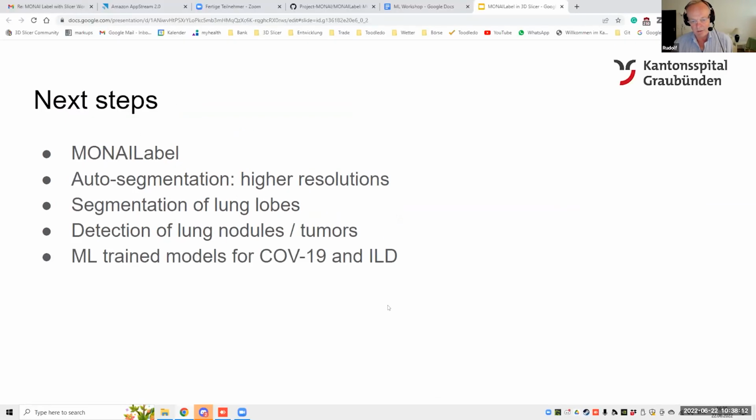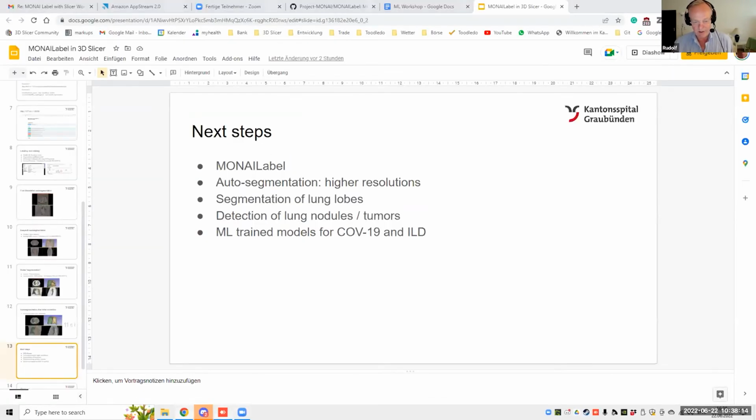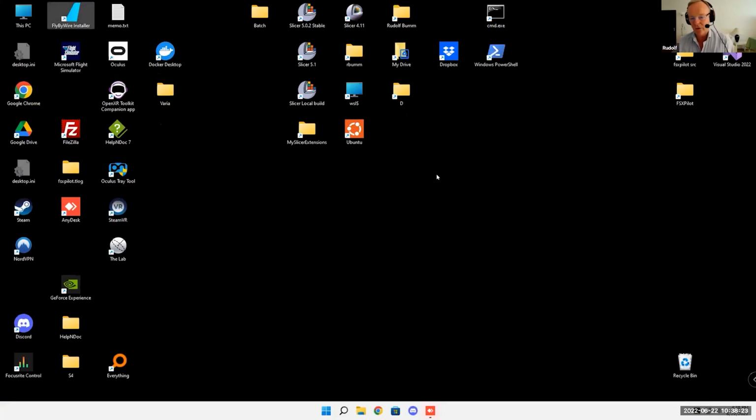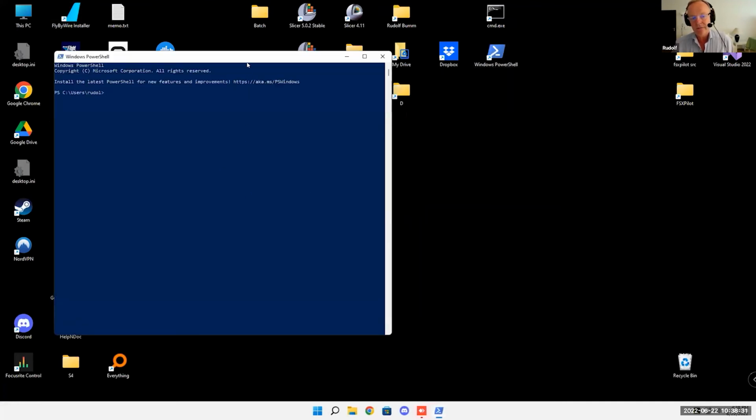Before I finish my speech, I just want to show you the view of my local server where I do all this, and show you how you can start the server. You just start PowerShell.